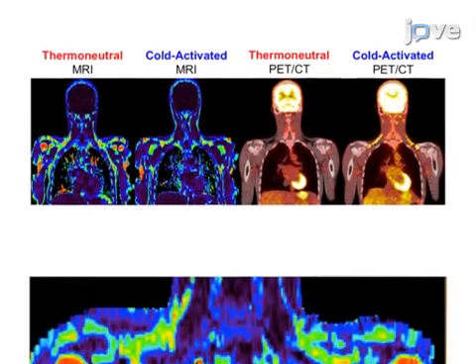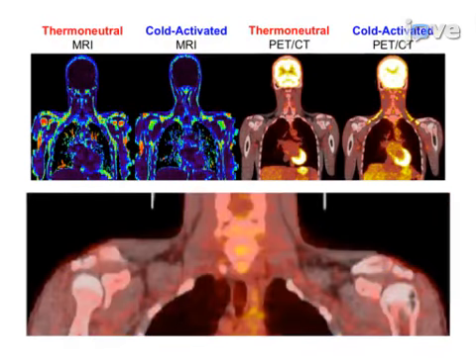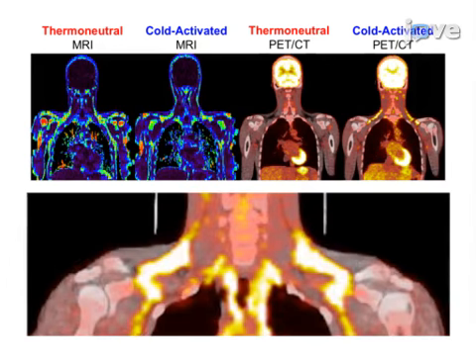The second step is to spatially register all 4 scans of one subject. Due to the difficulty of registering whole-body images, focus should be placed on accurate registration of the supraclavicular region.